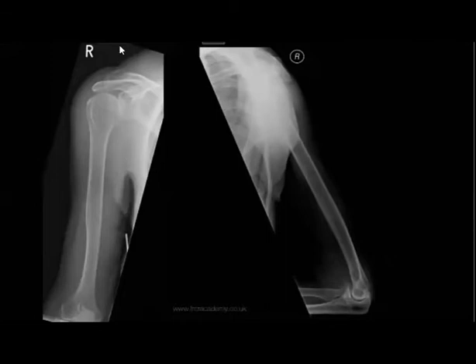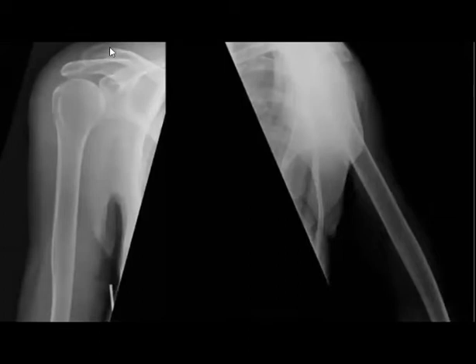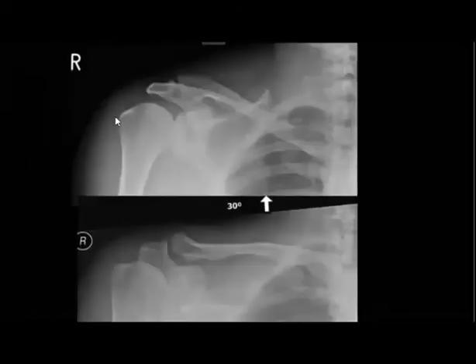Again, one of the most important things when you go to the upper limb: if you have any picture of the upper limb, check for the clavicle. Sometimes it is obvious like this one, and sometimes it can be subtle. Again, in rapid reporting, they like to show you the clavicle. So again, it's a clavicular fracture.